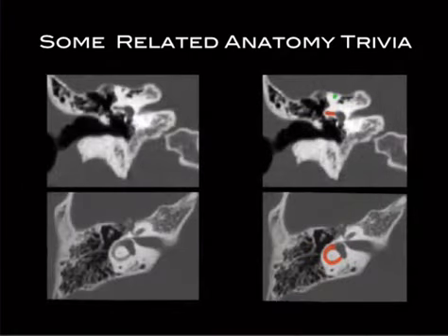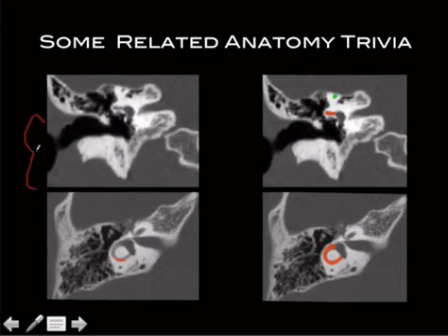And now let's list the last piece of anatomic trivia. We're seeing the semicircular canal, this thing here, and the one that's pointing, so the ear's out here, right? Maybe we'll make it look like mine with significant cauliflower on it. But you have to earn that, by the way. You don't get that for free. And so this is the lateral part, right? Because it's pointing lateral.